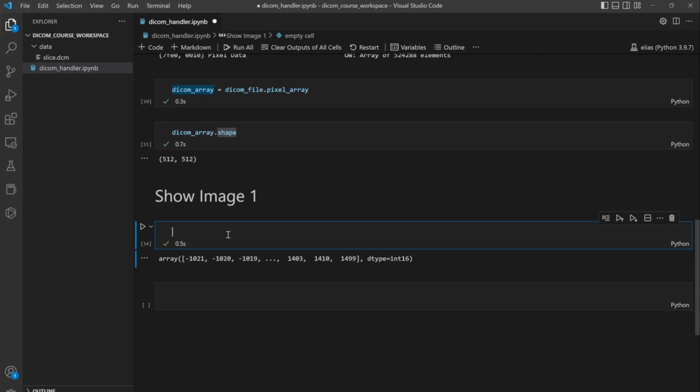To do this conversion, we need to normalize the image, which means that we need to convert all the values that you see here to the range from 0 to 1. The minimum should be 0 and the maximum should be 1. If we leave them as integers and divide, we'll have only zeros and ones, so the image will be different from what we want.